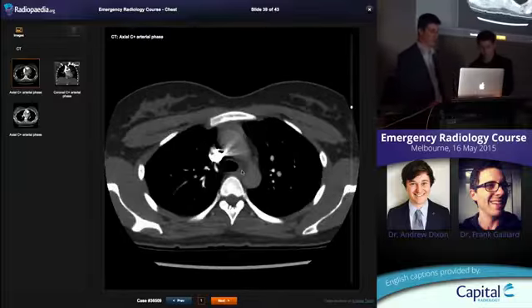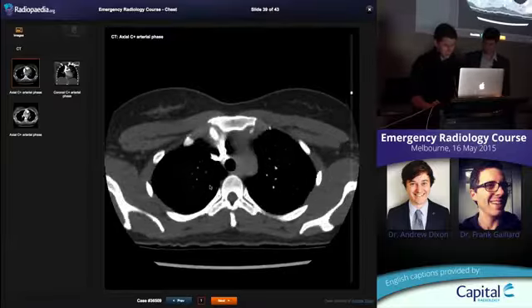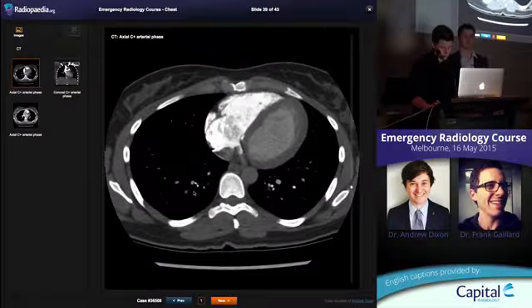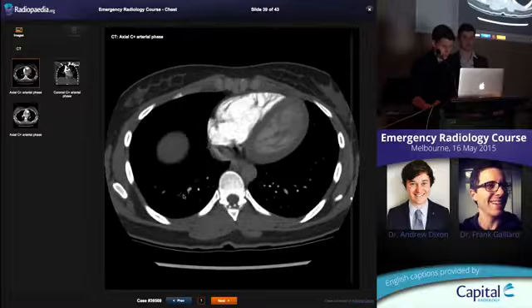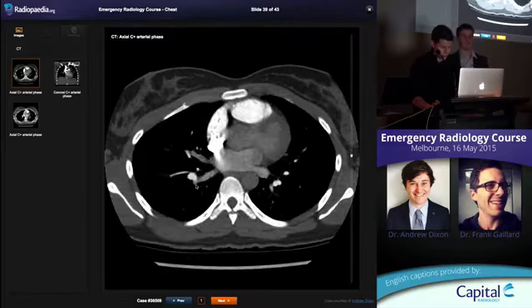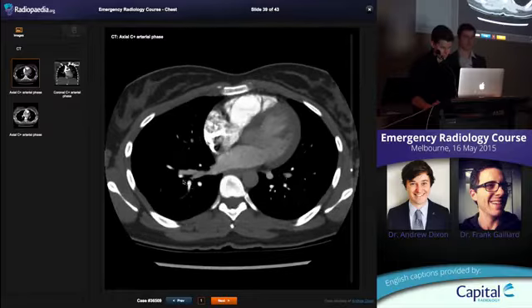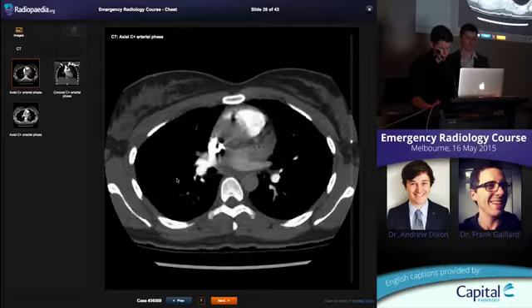Alex, do you reckon you can drive it? Yeah. Good man. So he's going to follow the vessels out. Just there. So there's bright contrast and then there's not. Correct, yep. And you see any other ones? Second one, there's a... No. That one's a bit hard.